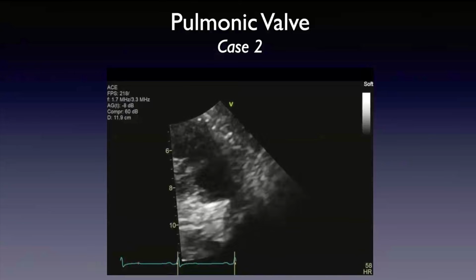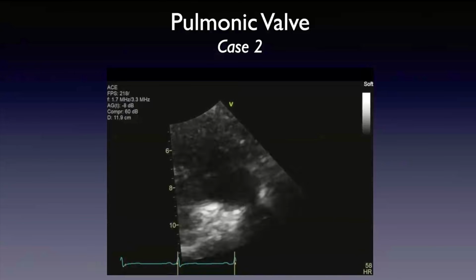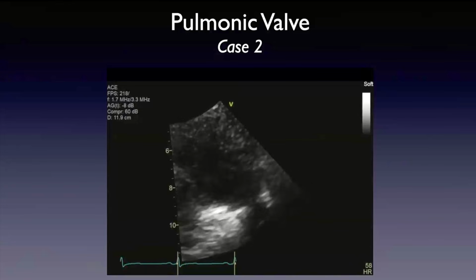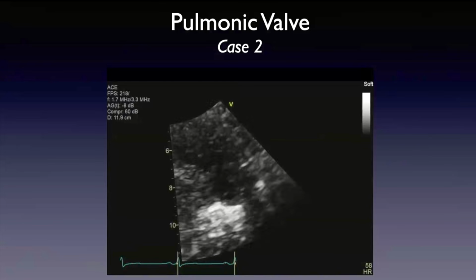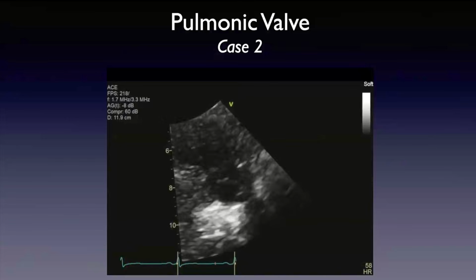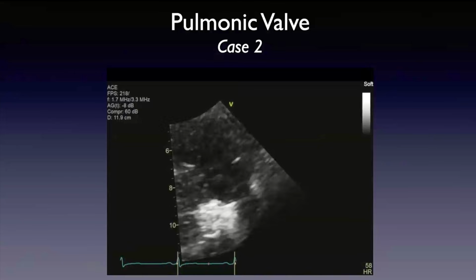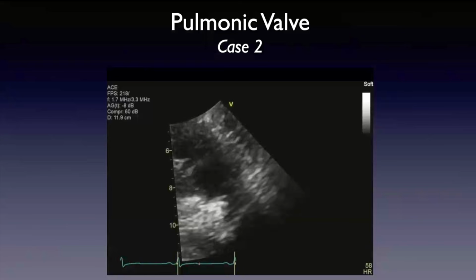The only caveat is that in my reading I didn't realize that there were sinuses as well. But with that doming, they almost coincide in the same area, so it's really difficult. Even on the mild one you showed, you can see that when it domes, it comes where the waist is, where the sinotubular junction is. That makes sense because that's the anatomy of the pulmonic valve.